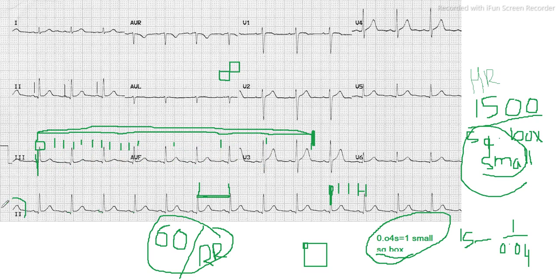You count in lead 2, okay, because this is the rhythm strip. These are different leads, lead 3, aVF. So once again, we started from here. In a 6 second time period, you will be having 30 big square boxes.